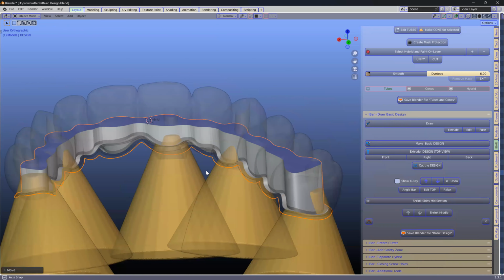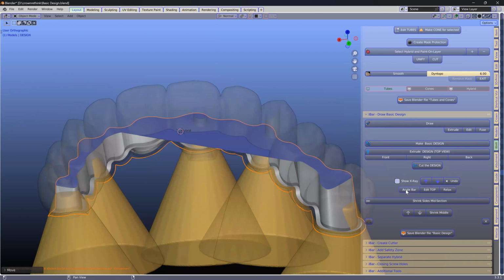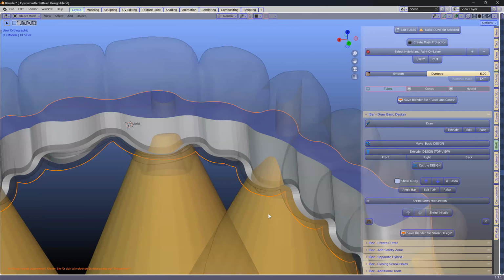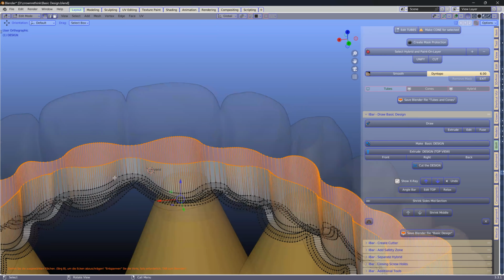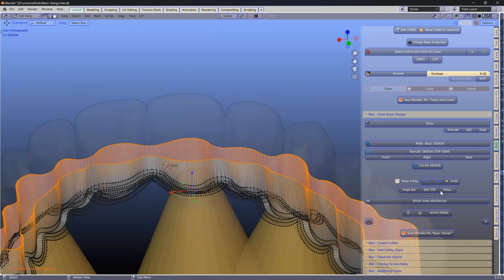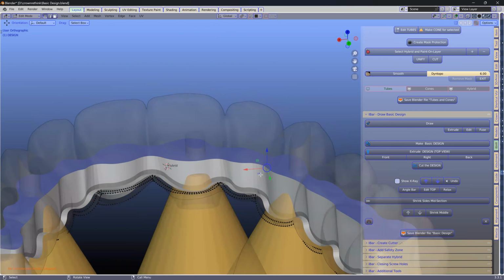Then we can angle this bar if we want to make it a bit thin on top. Now you see what happens, so I'll just go back a few steps. That happens if the vertices overlap each other. So if I angle and they're too close, you can relax them. If you click on relax, then you can relax it, and then you can continue to angle further.